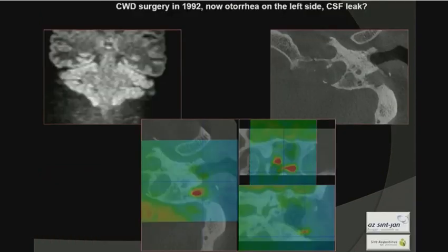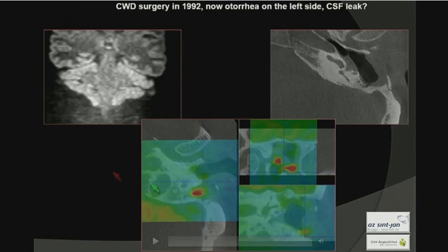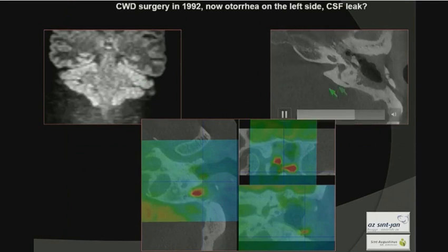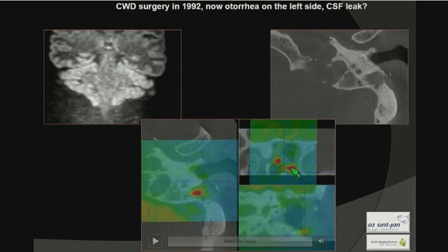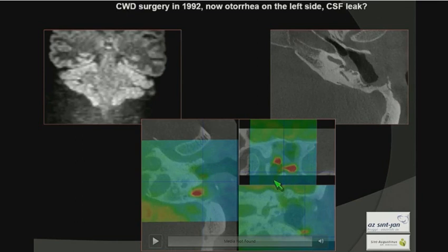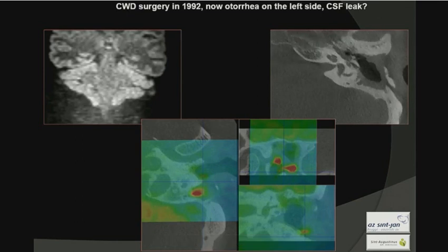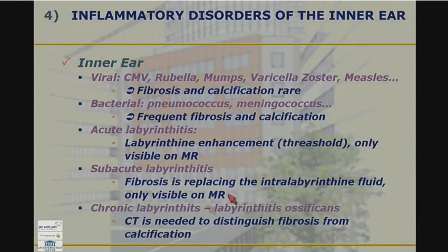Impossible. So you see today the diagnosis is made on MRI, and what we do actually is we do the non-EPI, we do the cone beam CT low dose, and then we fuse them, and then you know exactly where the residual cholesteatomas are. So the surgeon has the roadmap, CT, and he knows exactly where to go to take out the cholesteatoma. Last point is the inner ear infections.